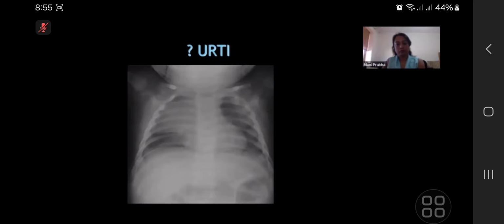Yes, please, go on. It's a frontal chest radiograph of a, probably, I think, premature infant, which is demonstrating opacification of the right upper and middle zone. The left-sided lung is normal, so is the right lower zone and apex. I cannot see any other abnormality.